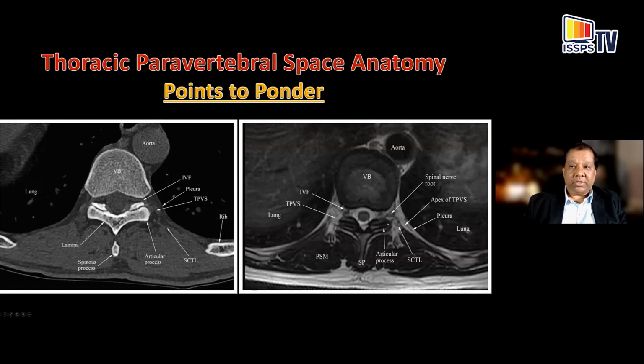I would leave it at that, and I think we can all ponder about why these are not seen in CT or MRI, as you can see in this image. It's actually one of Kenneth's images. You can see here that this is indeed the paravertebral space, but the resolution of MRI in this is not as high as the ones that the Korean group have used. So this may certainly be one of the reasons.